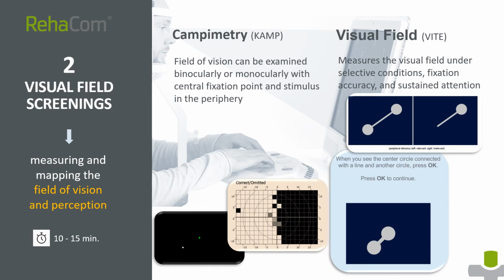It is recommended to use a maximally large screen in order to offer a sufficient visual angle area. In addition, we also offer a chin rest for head fixation. The chin rest allows a reproducible position in front of the monitor, remaining the same throughout the test or the visual field training.